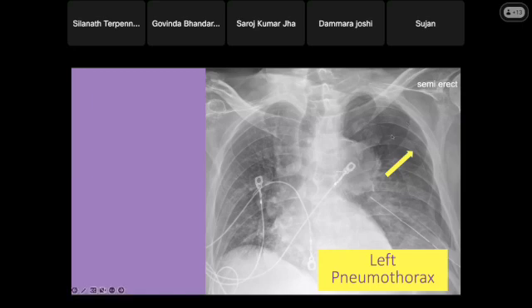Okay, this is an example. Is this obvious? Because I have a little pneumothorax, it doesn't pan out very well, so I choose the big one here. Whenever you see the pleural line, and this is a lung that is a little bit collapsed, and this is the air in the pleural cavity here. So this is an example of left pneumothorax.